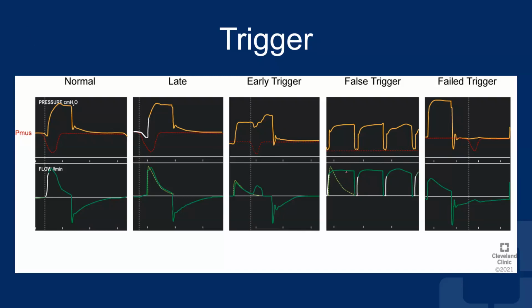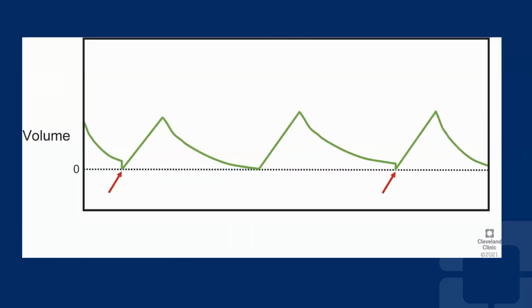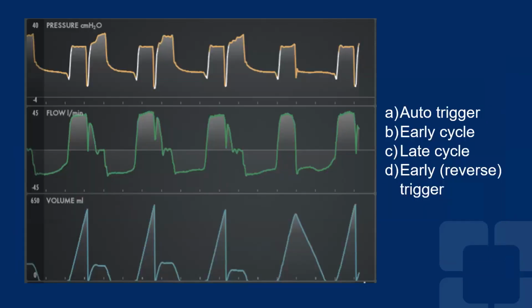And actually, if you look down here, the patient was doing so much inspiratory effort, the breath stopped, and the patient immediately got another breath. And then the breath of the patient ends here. And then you can see here a late cycle. So essentially, this is a classic example, Jay, where the cause is an early cycle, but it's causing on the second breath a late cycle, and you're not going to solve the late cycle. What you need to solve is the early cycle. So you can have several abnormalities on the same breath.